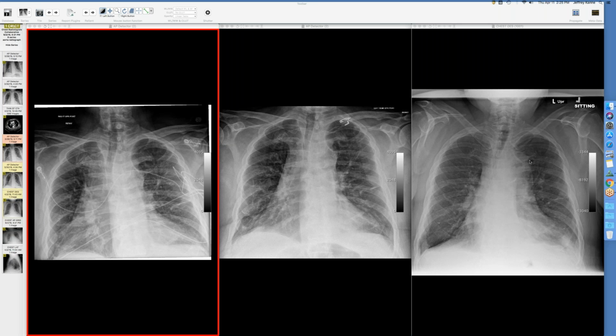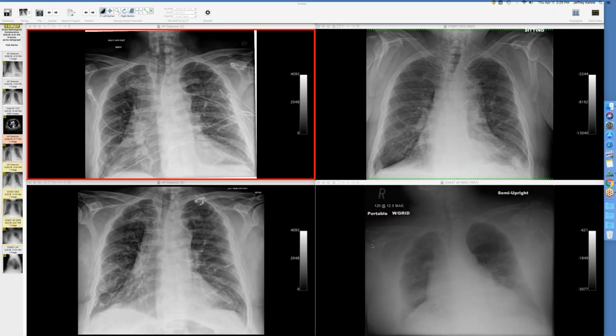You can see there's a new interface. This is before. So there's the aorta. You can see maybe a little something there if you go back. But compared to the original one from 2016, which I'll put here, you can see normally it was just the aorta. So there's a little bump there. Harder to see on this one. But then on this one, this bump gets a lot bigger. And then there's the calcification along the aorta. And you'll notice there's mass effect on the trachea that seems to be increasing too. That is interesting. Something's going on.